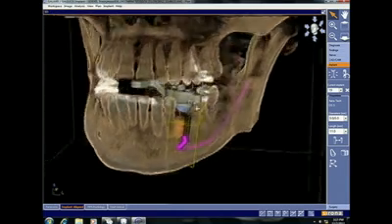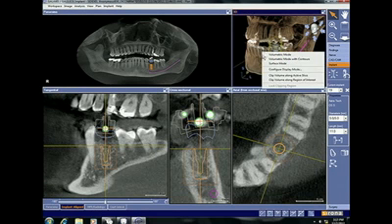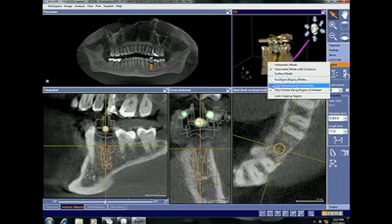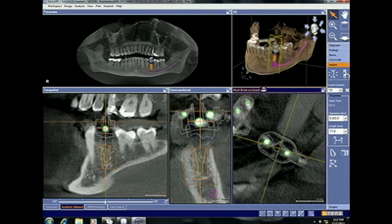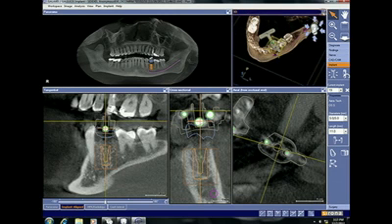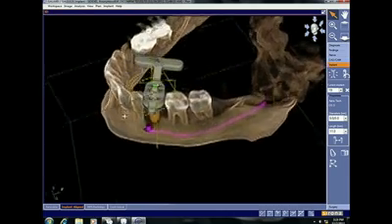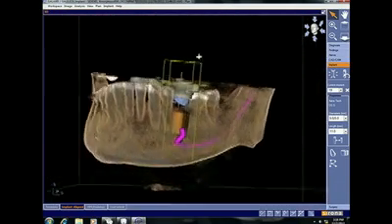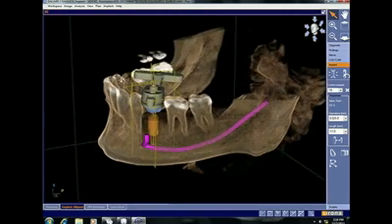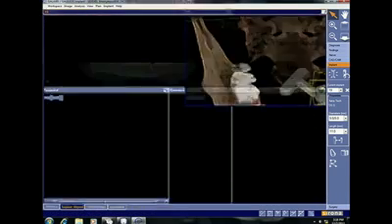And now we can make sense of everything here. You'll be able to identify this reference body. I'll clip the volume here so we can see that. So here's our reference body in the mandible as it's seated in the yellow wafer, which obviously doesn't show up because it's not a radiographic material. But we can at least see the relative position of that compared to the planned implant. At this stage, we are actually ready to completely mill the insert.